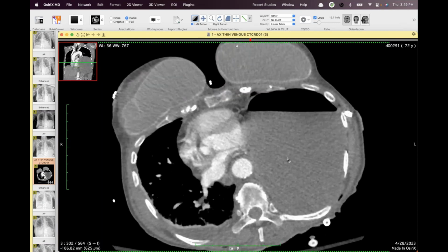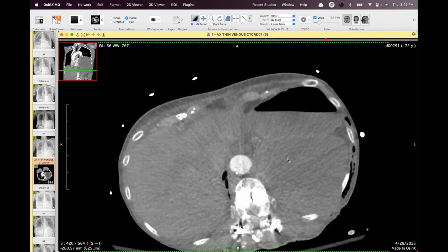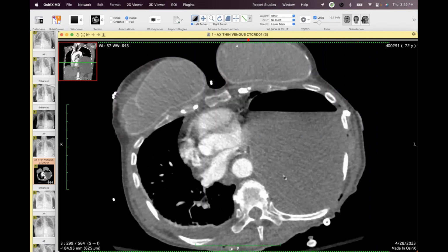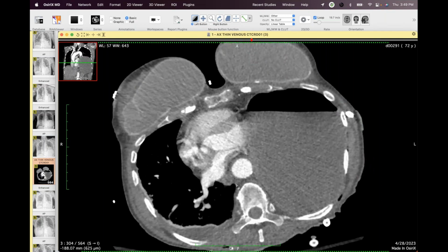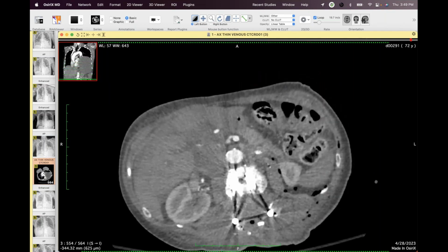Oh my God. Could you tell here that it was incarcerated, or was that a surgical thing? They went to the OR a couple of hours after I said this. That'd be a really good call, because I don't see any gas in the wall or anything. No, I mean, it just looked like they might be obstructed. Their esophagus was dilated, the stomach was dilated. They were decompressed distally.